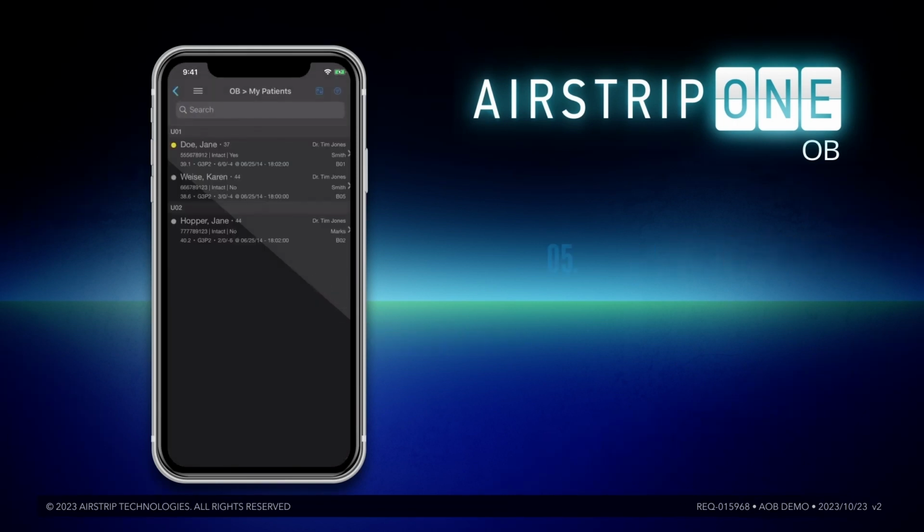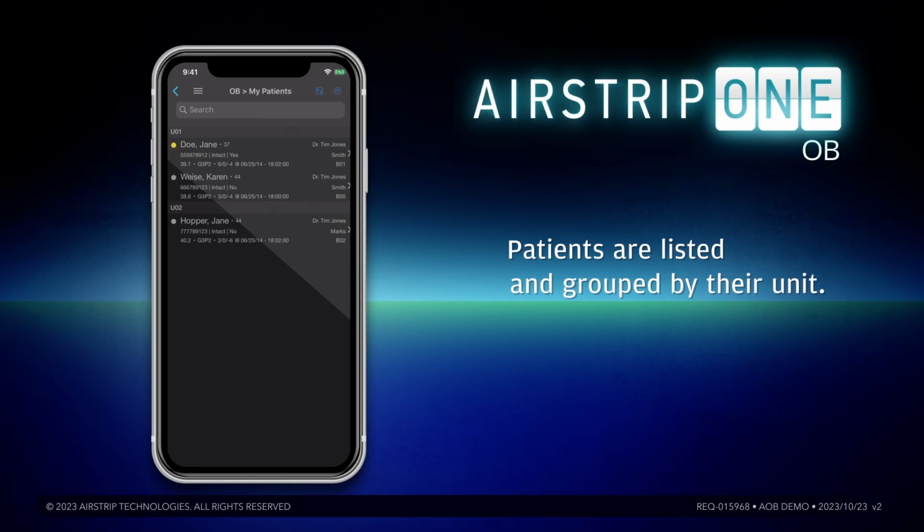Selecting My Patients will bring up an OB census list. The census list is typically grouped by unit, and sorted within units by last name. Our sample patients list includes 2 units, and patients listed alphabetically by last name.